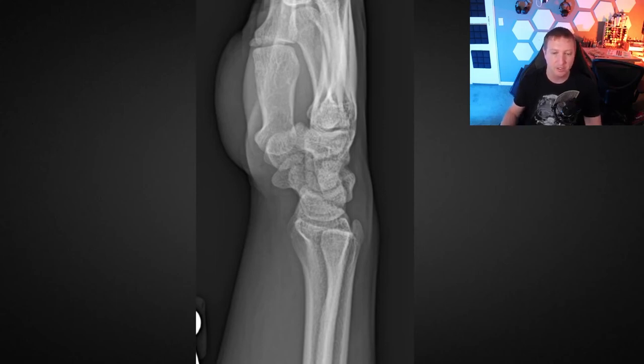All right, so those are the bones of the proximal carpal row. The pisiform, which we can see up here as well. And this is actually partly how we determine how well positioned the lateral is. The anterior cortex of the pisiform here should be about halfway between the capitate and the scaphoid. So a scaphoid here in purple, the capitate anterior surface here in yellow. So the pisiform, let me just trace that out a bit better here, you want right in the middle there. And this is, you know, a perfect lateral if that's our metric.